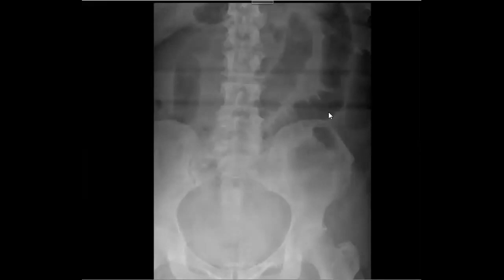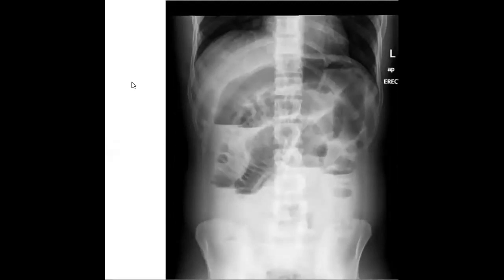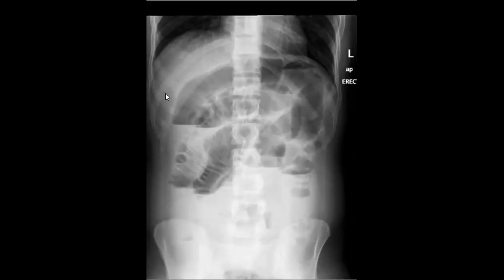Small because this is the characteristic of small bowel, that the valvulae continue from wall to wall, and there is dilatation more than 3 centimeters. And you can see that there are multiple bowel loops. So this is a small bowel obstruction. Again, the same here. You will check for any perforation, and you check if there is concomitant large bowel obstruction or large bowel dilatation.